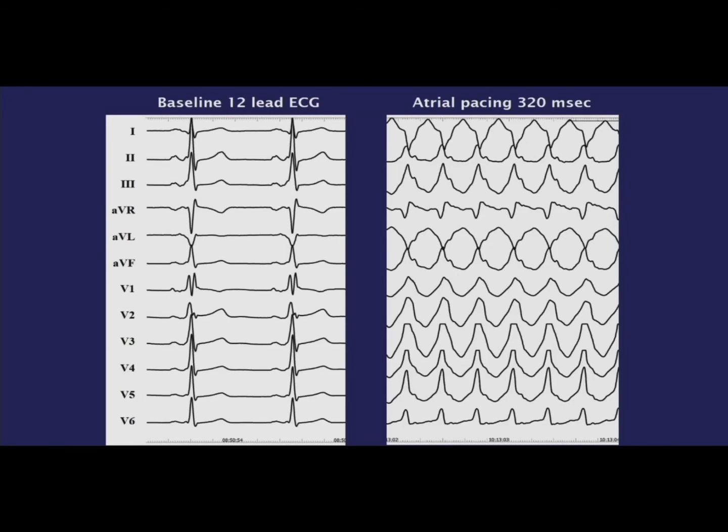This is EKG, guys. You learned this during your cardiology fellowship. So you have a whole mitral annulus. You could have an accessory pathway at noon, at 3, at 6, at 7. How do you decide where around that circle the connection is? Let me teach you something I learned in my first year of cardiology fellowship.